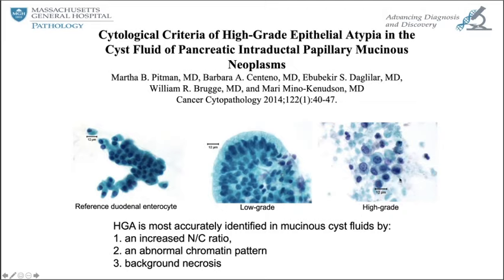It sort of mimics high-grade dysplasia in a PAP, a glandular cell that has become high-grade looking. It can be difficult to distinguish a squamous cell from a glandular cell when they get to be this high-grade looking: high NC ratio, scant cytoplasm, losing its mucinous cytoplasmic compartment.